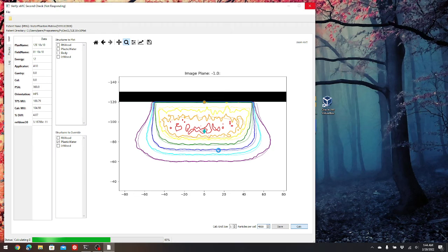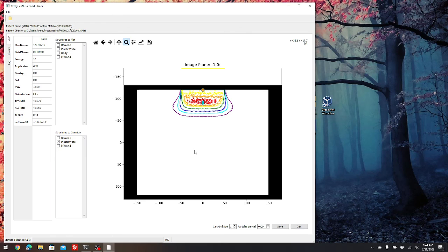And you see it says not responding there. It really is doing something in the background. Just give it a second. If you are on a higher resolution or a higher powered machine, this doesn't take as long. I have an Eclipse machine with one of the P5000s, and it works a lot faster than this.